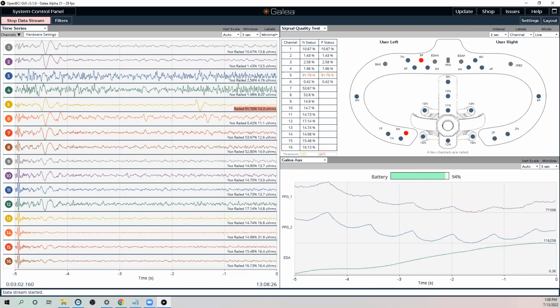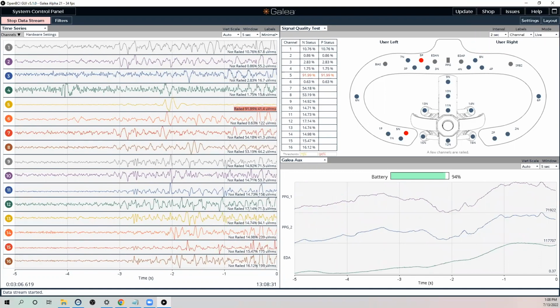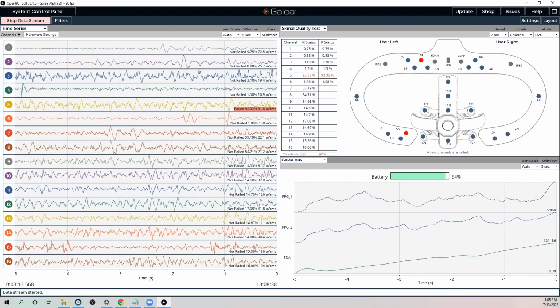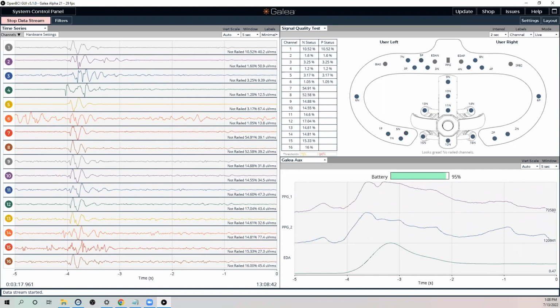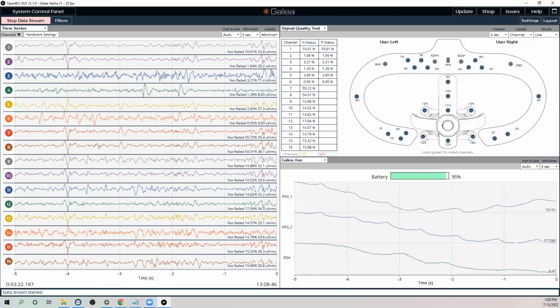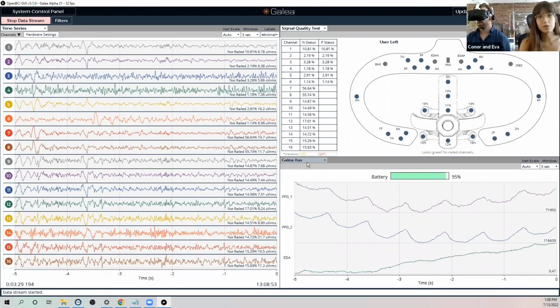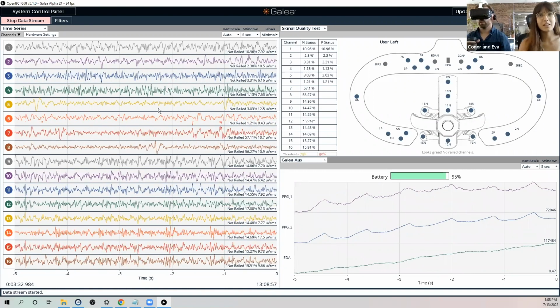So it's a little choppy because of the Zoom screen sharing, but it's really anyone who's screen shared video over Zoom, the aliasing of this is much smoother in the actual programs, which you can see on YouTube. We have a couple other videos of the data in action. All right, great, thank you, Joe. So it's a little choppy because of the Zoom transmission, but you should be able to see the different widgets with the data coming in.